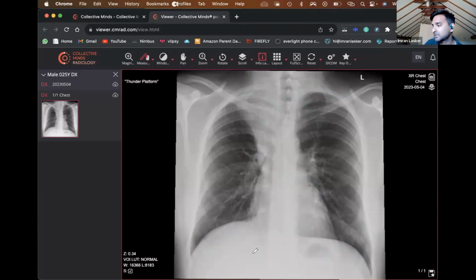I'd say this looks like a normal chest X-ray. I don't think it's grossly abnormal. My check areas would be the hilar regions, the lung apices, the costophrenic angles, below the hemidiaphragms, and behind the heart. Everything looks okay from my point of view, and then I move on.